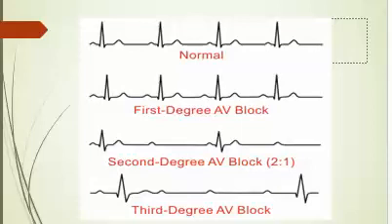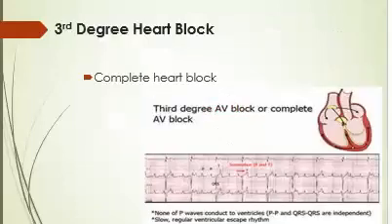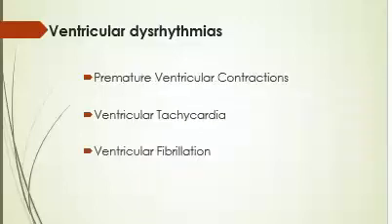There is no connection between each other. Everybody is operating what we call independent. They have gotten a divorce. And this is pretty much what's going on here. You see lots of P waves and not so many QRS. Remember, our cardiac output comes from QRS, from ventricular contraction. Hope that all made sense. Okay, cool. Let's move on, guys.